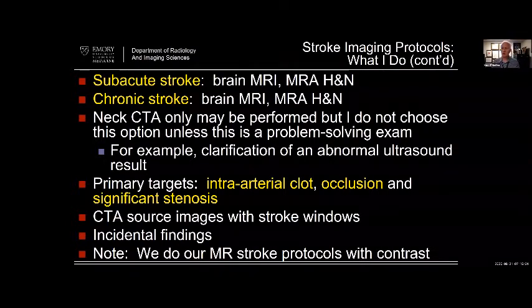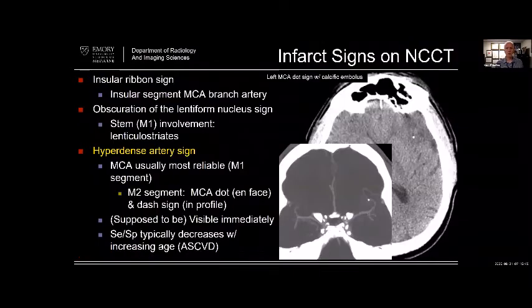Don't forget, you can use stroke windows to help yourself. You'll see some pictures as we go through that. And of course, there are incidental findings as you go through cases, so don't forget about those. And we do our stroke protocols and MR with contrast, but I understand we wouldn't necessarily do that.